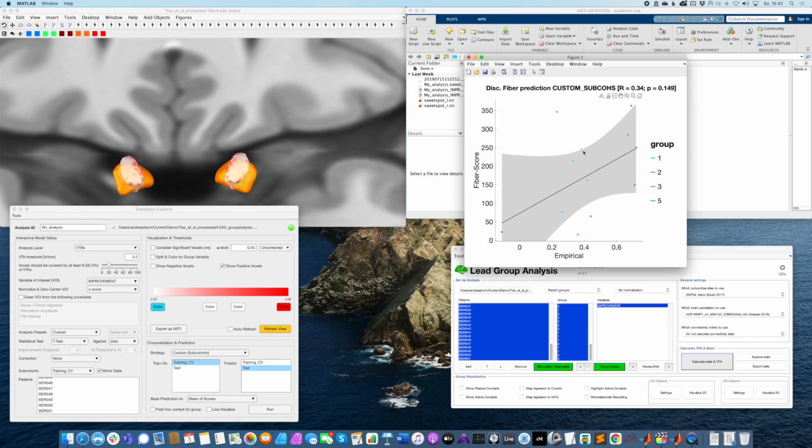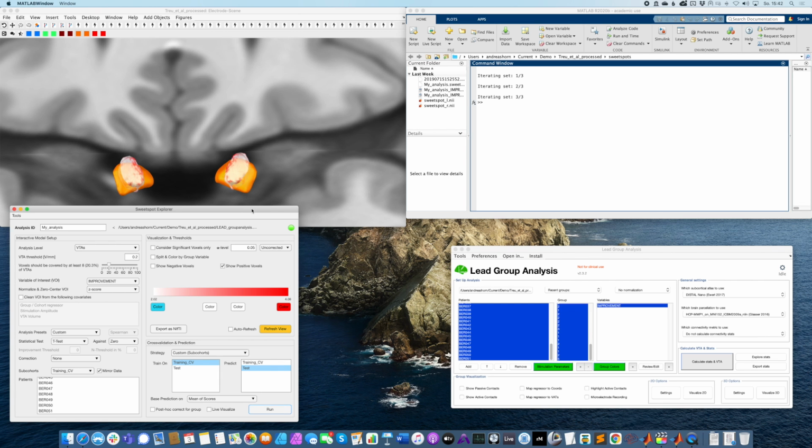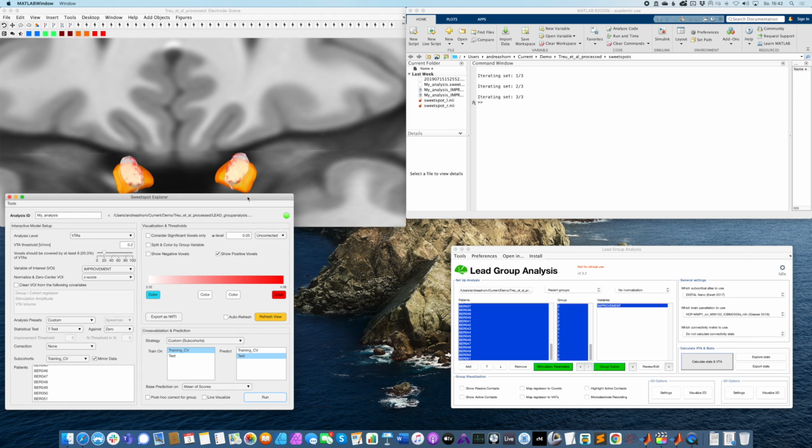So design the experiment better than I just did in this example, thinking about effect sizes and so on. But once you divide your data set up into a training, cross-validation and test set, that will be helpful to then create a meaningful analysis.